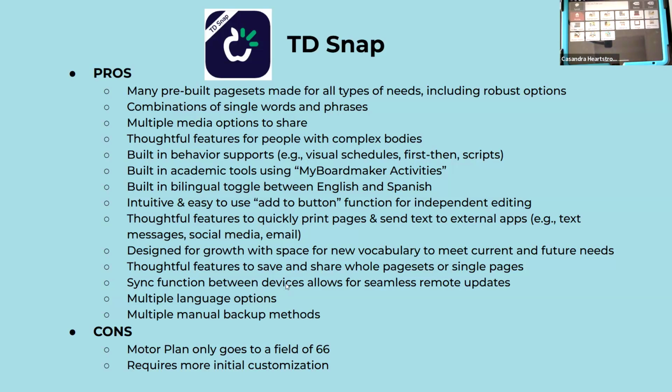customizations. You can share whole page sets or single pages within this. You can use the sync function to, like, I could edit a student's device on mine and then push sync and it will automatically sync with their device. There's tons of language options and there's multiple backup methods.